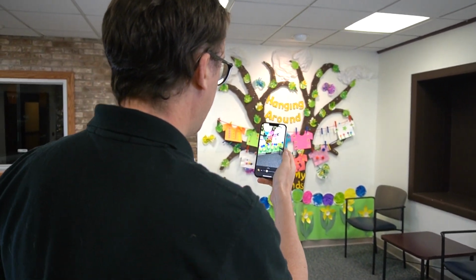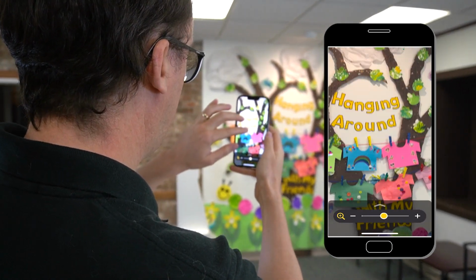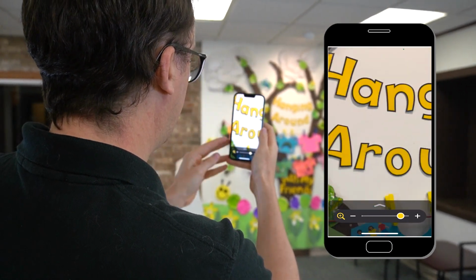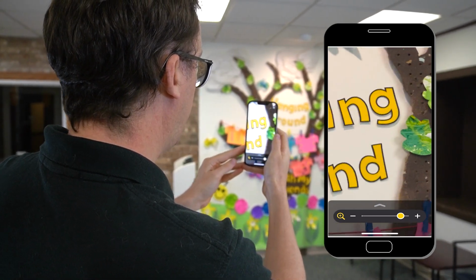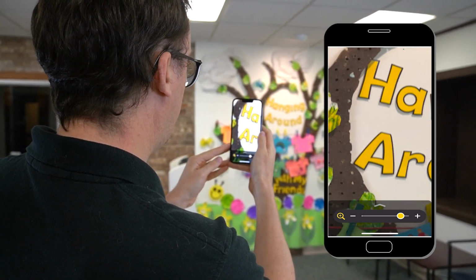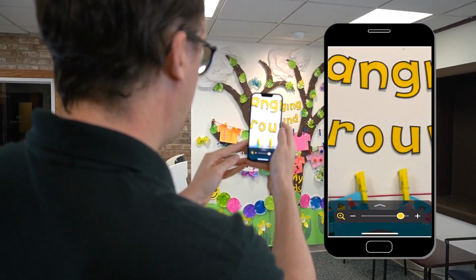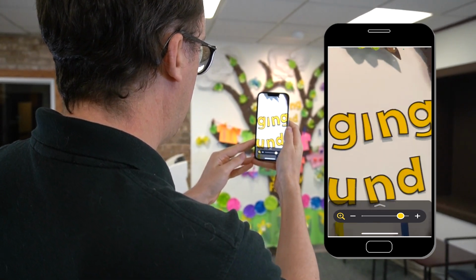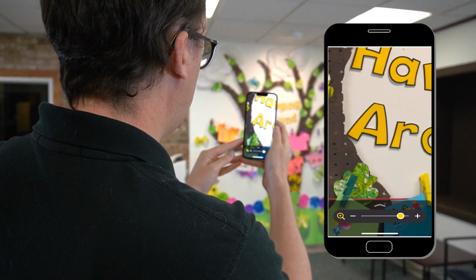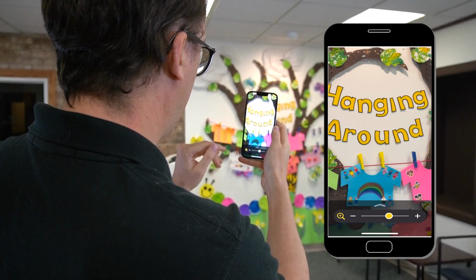Open up the magnifier, and again, we are going to look at this hanging around. We will zoom in using our pinch zoom, and first of all, let's check out the stabilization side of things. So this one, I would say, has less pronounced stabilization, or maybe it doesn't have any at all. It's hard to say, but the image does bounce around a little bit more. And so that is one thing to bear in mind. Depending on how steady your hands are, you might find that this doesn't work as well as the ReBokeh app for things in the distance.